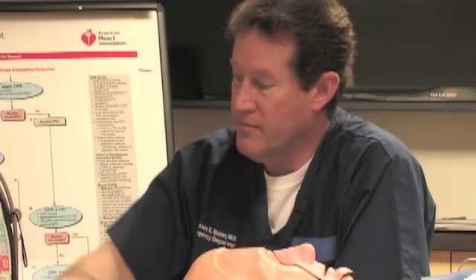And this concludes our review of EKG dynamic rhythms off the cardiac monitor. These are the same rhythms that you're going to see during ACLS class. Again, this was a preview of material that you can view and study before attending ACLS class. This will hopefully facilitate learning, get you ready for ACLS class so that you can understand the concepts and identifying rhythm to algorithm, and hopefully make learning a lot easier and much more enjoyable for ACLS class.